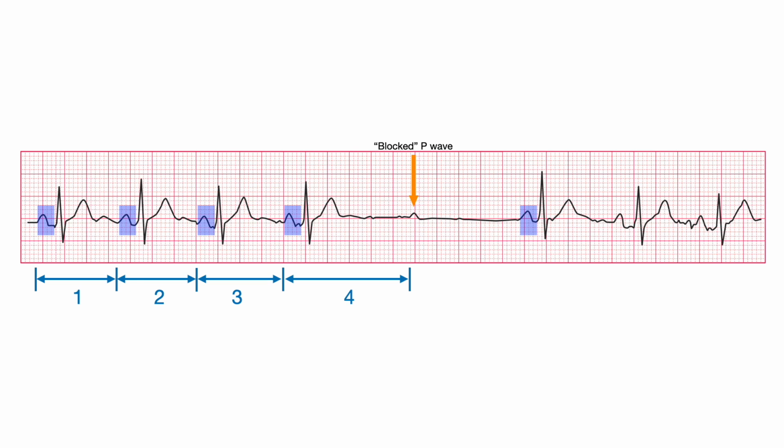Do not be tricked into making the diagnosis of Mobitz type 2 AV block by seeing a constant PR interval before and after the blocked P wave if there is ongoing change in the heart rate. Mobitz type 2 block always occurs below the AV node in the His-Purkinje system. It is serious because it can unpredictably progress to block of many P waves, leading to cardiac arrest called asystole. Mobitz type 2 AV block requires treatment with a permanent pacemaker.